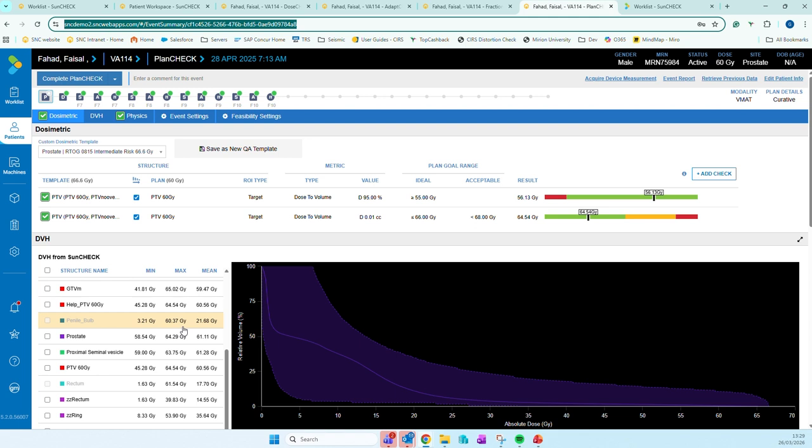The other option that you can upgrade to is, if you wish, a Monte Carlo dose calculation for your initial dose check plan. So you could upgrade to the SciMoCa Monte Carlo for your initial dose check event as well, if you wish to upgrade to that.